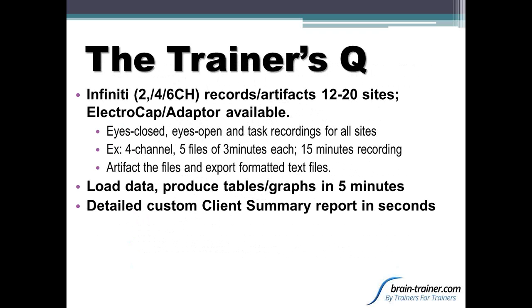Then to actually load that data after you have exported the files, the package that we already have that's already available to you for Infinity, the TLC Suite, already does that for you. Then you load that into the Excel form, and it produces a whole set of graphs and charts and tables that you can look at if you're interested in learning more about the brain, different views of the brain, and as you get more comfortable with it, you're going to get more comfortable with being able to make your own adjustments to your plans.